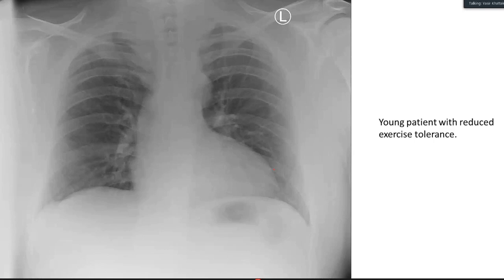Okay, and the echocardiography comes out to be unremarkable. How strongly do you think there is an aortic dilatation? Is there, or is there not, or do you just think it is? Yes, sir, I think it is.